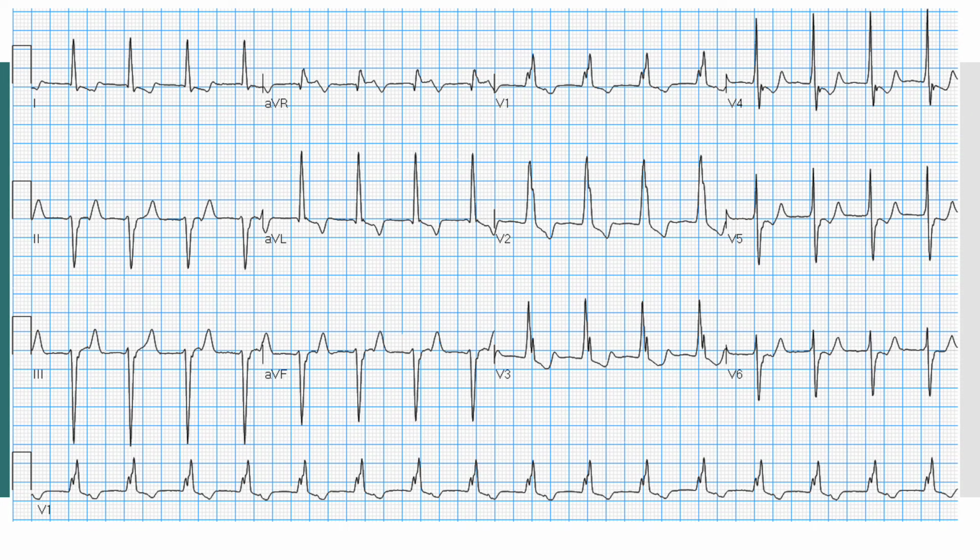This is an example of a classic wide complex tachycardia which has the usual differential diagnosis of VT, SVT with aberrancy, pre-excitation, pacing, and artifact. And I always make this statement every time I'm evaluating a wide complex tachycardia on a formal basis. We can exclude pacing because I do not see any pacing artifact. We can exclude noise because this is a very clean tracing. And it is not a pattern for a classic pre-excitation, although we don't have a baseline ECG.